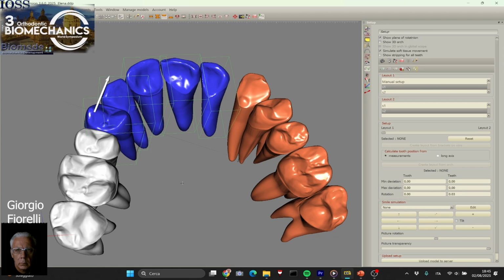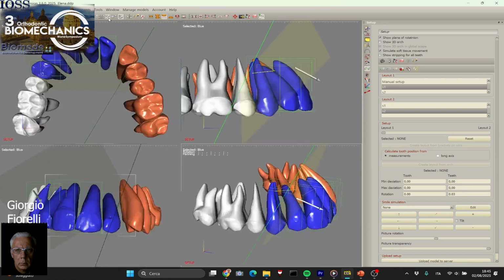But actually, finding these two planes is essential for us to determine finally the vector in 3 dimensions. Anyway, we cannot go too much in details, and I just want to show you how the force vector is represented in 3 dimensions.